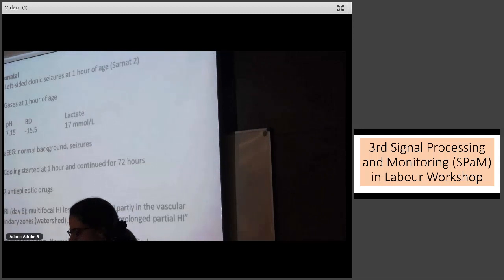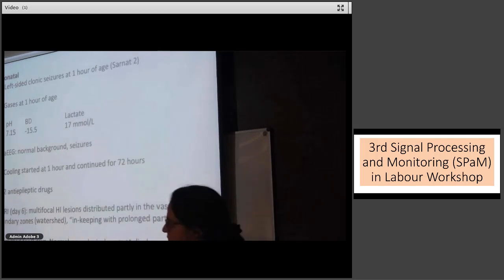The timing of the injury is probably, I wasn't keeping track of the time, but it's probably that threshold effect. And when Diogo pointed out this is different, that is probably when you're allowed to say it is already injured. So I don't know when it got injured, but you now have a point to look back and say you are now injured.